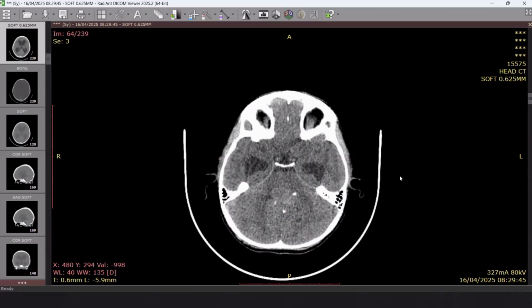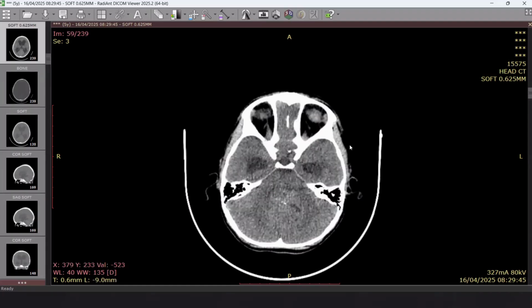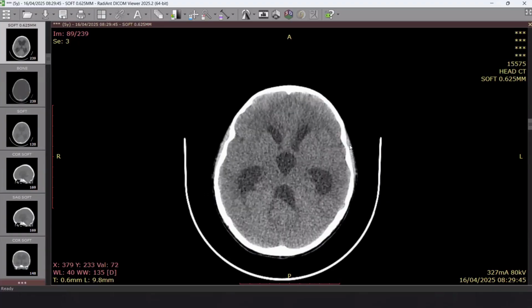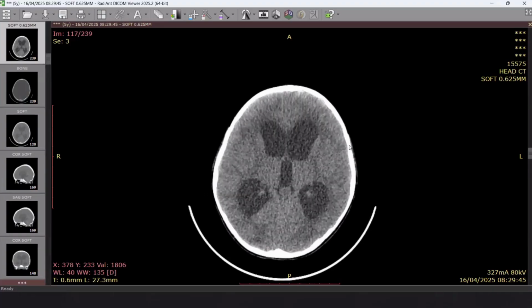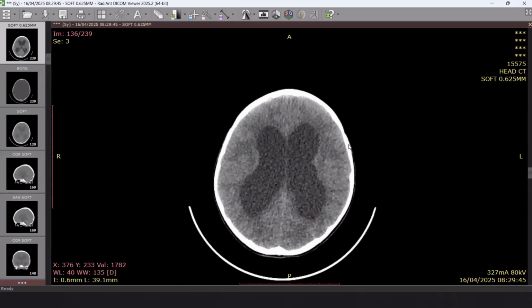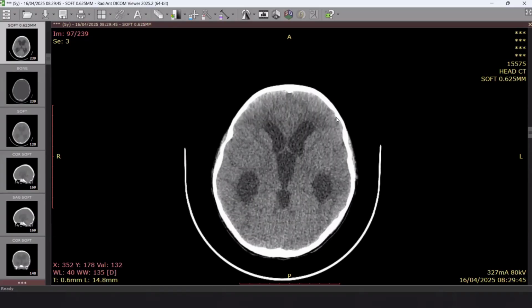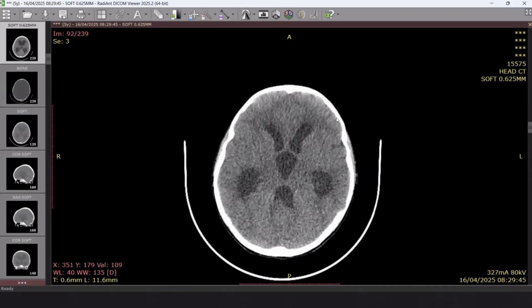Okay, but I totally agree with you that the top differential diagnosis is ependymoma and medulloblastoma, and I think it is complicated with extensive supratentorial hydrocephalic changes, needing urgent neurosurgical consultation and shunt placement to relieve the hydrocephalic changes. Thank you so much. Candidate number 2.